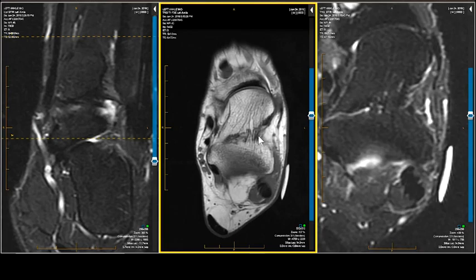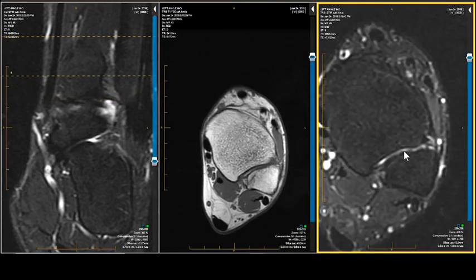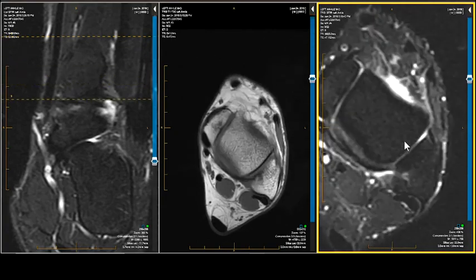What about the high ankle? That's on our checklist. Anterior tib fib, intact. Therefore, all the others have to be intact because it tears as an intercalary process from anterior to posterior. So you can't tear this without tearing this. So it goes anterior, interosseous, posterior. And that looks just fine. There's the posterior. There's the anterior up higher. So no high ankle component.